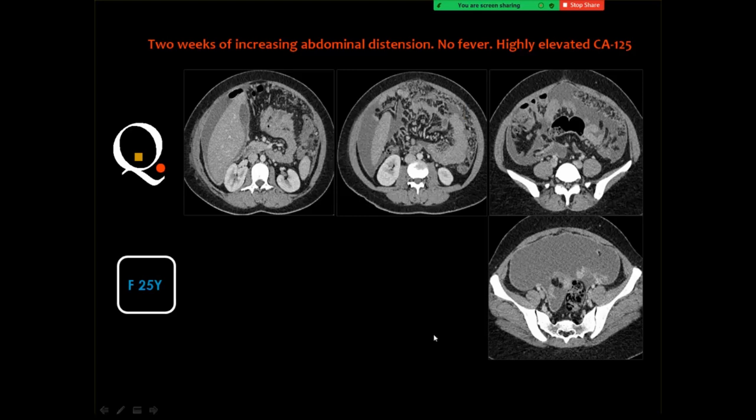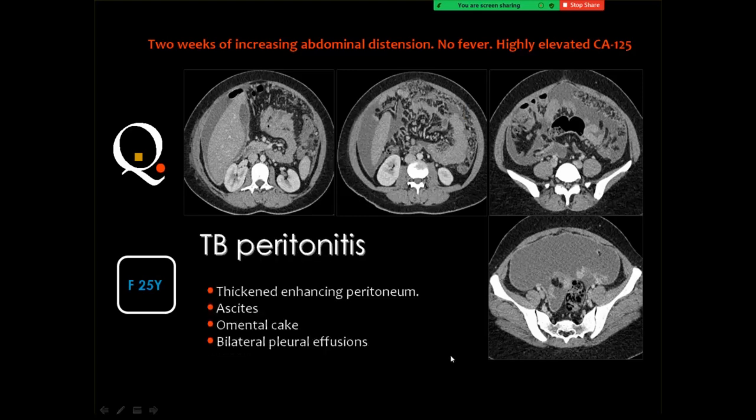You know that the omental thickening may be either an inflammatory pathology or a neoplastic pathology, and the neoplasm is usually towards the metastasis, but the inflammation is pointing to the most common lesion seen in our country, which is the TB.